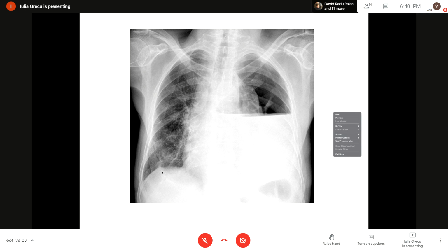Also, if you look at the contralateral lung, the right lung, you also see these fibrotic bands and a bit of interstitial changes diffusely distributed through the right lung. So we can think that there already is some chronic pulmonary condition that could lead to other episodes of pneumothorax or hydropneumothorax in this patient, besides the size and the shifting of the mediastinum, which is clearly not looking good.